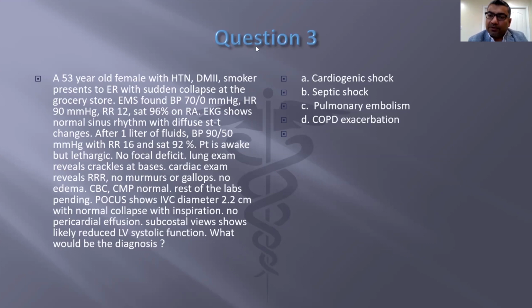Most of the time, if you don't suspect it and D-dimer is normal, you can use the TAPSE. And there is another one which you can use, which is S prime. It's the same as E prime on the lateral mitral annulus. You can use a similar one on the right side annulus to see how your S prime is, and the normal is more than 10 centimeters per second. Because sometimes you don't get a good TAPSE if you're not longitudinal or not in the best view, you may get it lower.